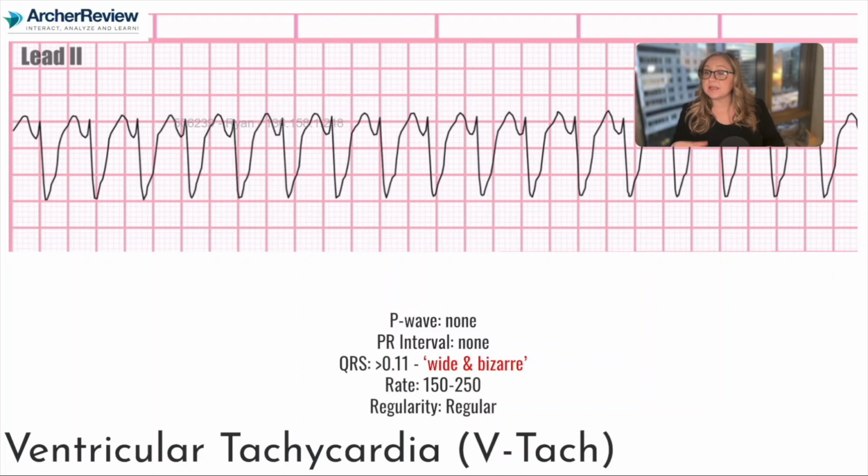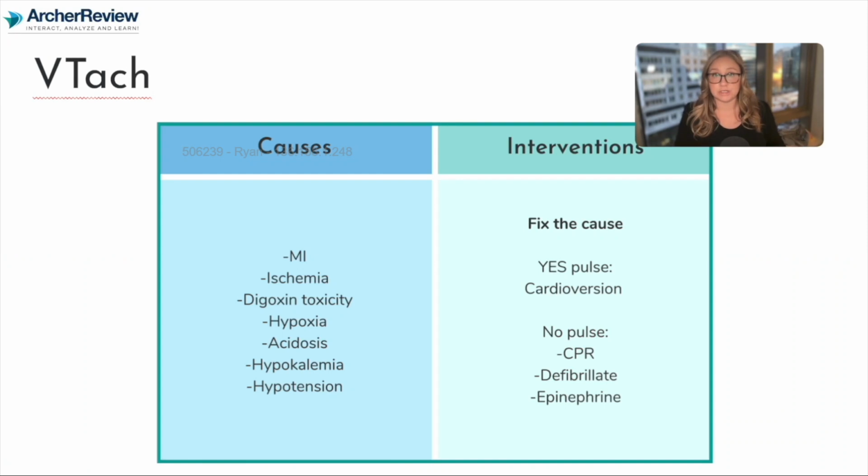Now, clients can have a pulse with VTAC. We have VTAC with a pulse and VTAC without a pulse. And you need to assess for that pulse so that you can determine your appropriate intervention.